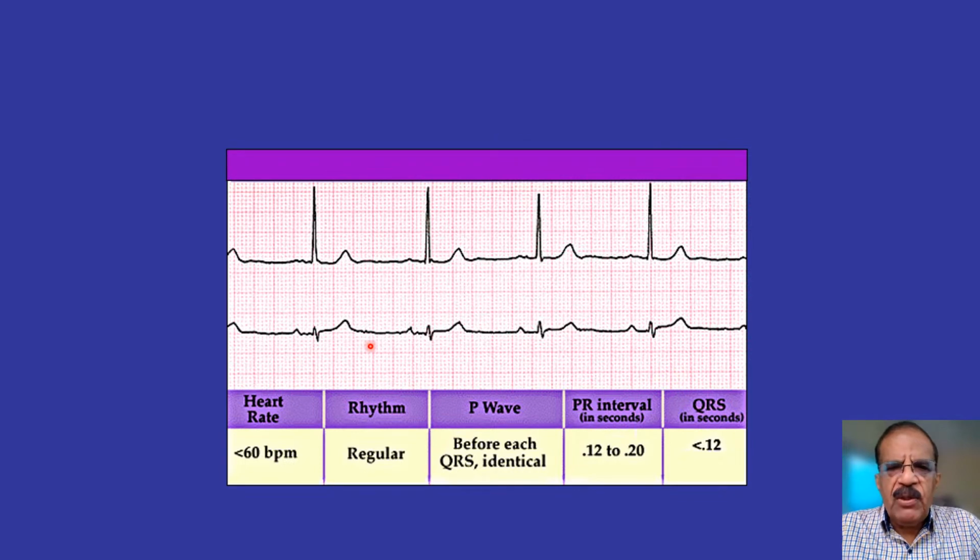Now, I will let you figure out what is this ECG. It is not a complete 12-lead ECG, just one strip. Now, you all know whenever we analyze rhythm, we just need one strip, but we need a continuous strip. Most ECG machines record 12 leads, they record 3 or 4 cardiac cycles, and then they change the lead automatically.